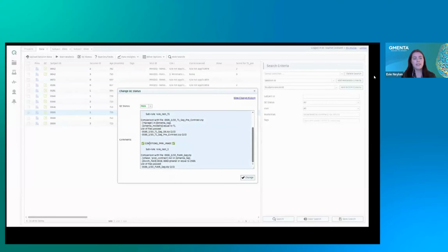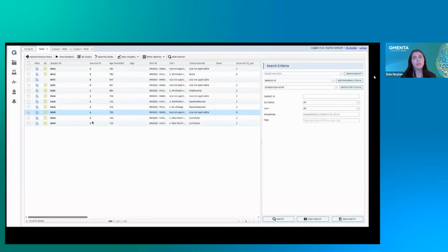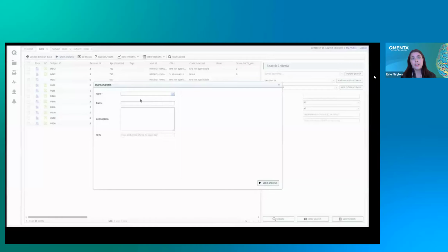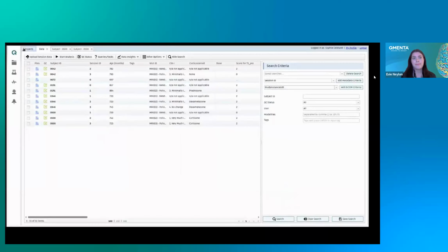Now, before we jump into lesion annotation, we do need one last filter, and that's RANO eligibility. So even if the images are technically sound from a protocol and integrity perspective, we do need to ensure that they're viable for RANO. To do this, the data manager simply runs the Image QC and RANO eligibility tool, and you can configure this tool to run automatically on sessions where the protocol is correct, and that just limits any clicks you have to make.